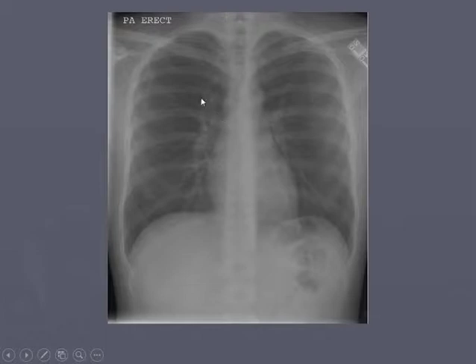And it shouldn't be across, and it shouldn't be like this. It should be what I'm seeing right here, it should be going up like one rib. So going from here to there, about that space, about a 20 to 30 degree angle.